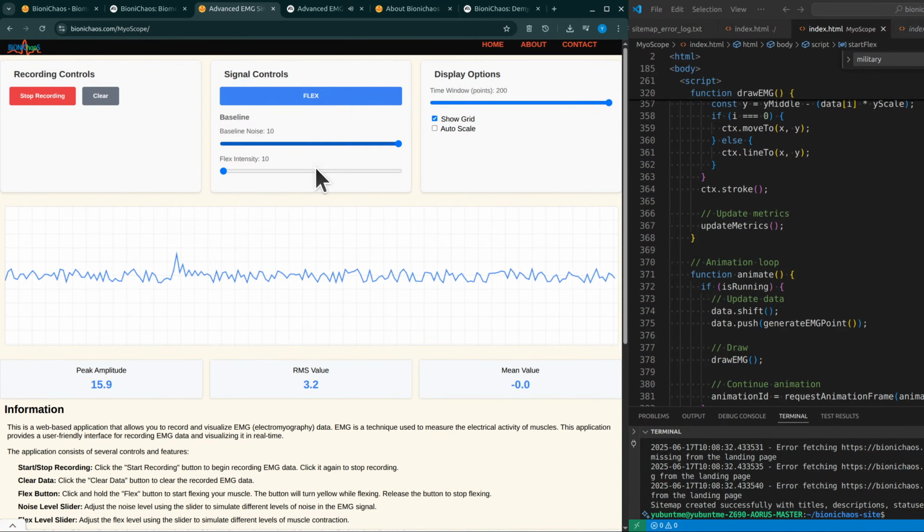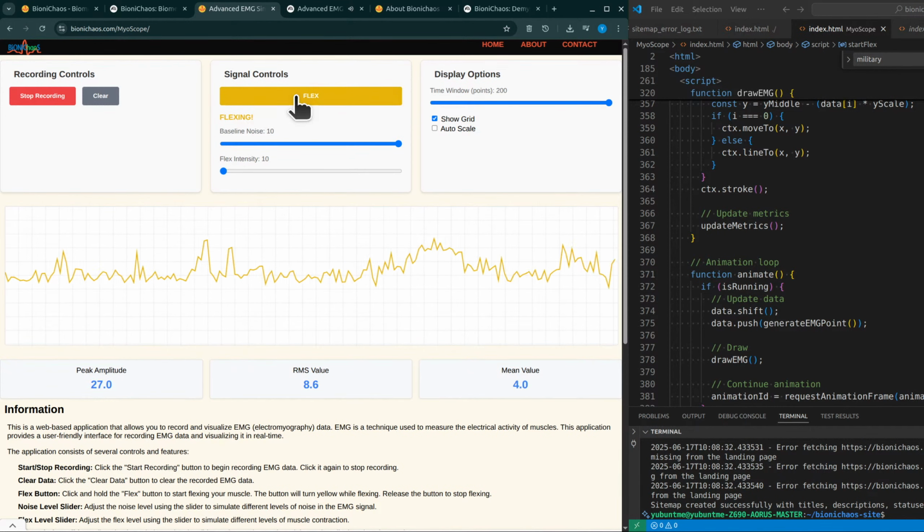It does, but it's super important in EMG. Think of it not as the peak, but as the overall effective level or power of the signal over time, like the average signal strength, but calculated in a way that properly accounts for the ups and downs. It gives a much better sense of the sustained activity level than just a simple average. So peak is the absolute top spike. RMS is more like the general energy level. That's a good way to put it, yeah.